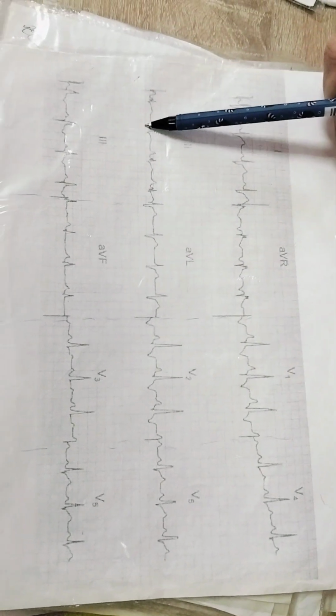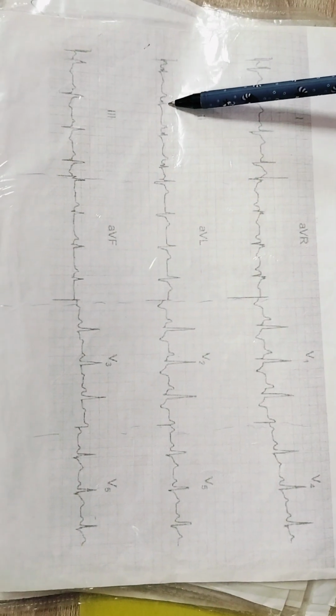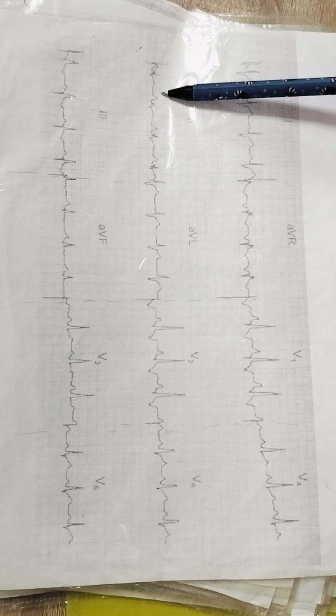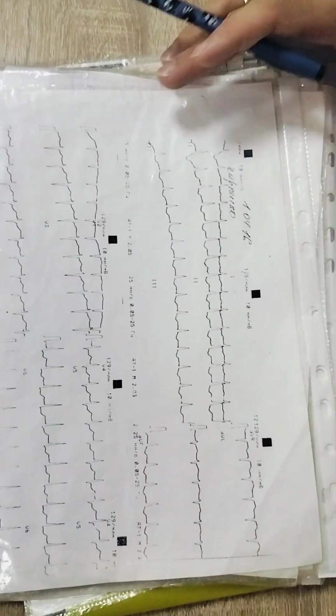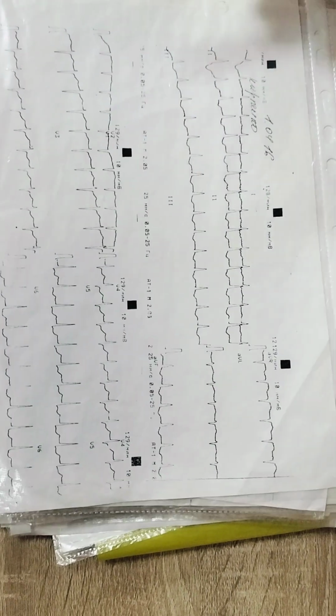And also there is one more pathology. P wave looks bigger than even R wave. It is hypertrophy of the right atrium. Big P waves. Put it to another place. Don't shuffle it with other cards, we will need it later.